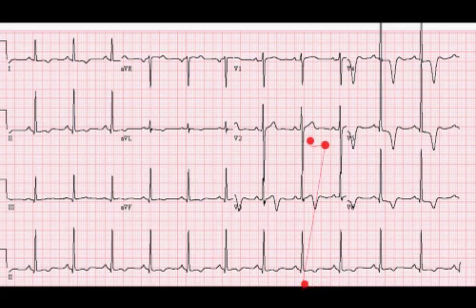Good. And there is a rhythm disorder that is simply sinus arrhythmia, I think. Doesn't seem to, no, there's hardly any rhythm disorder. All right. This is news to you. Now we're in another tracing now?